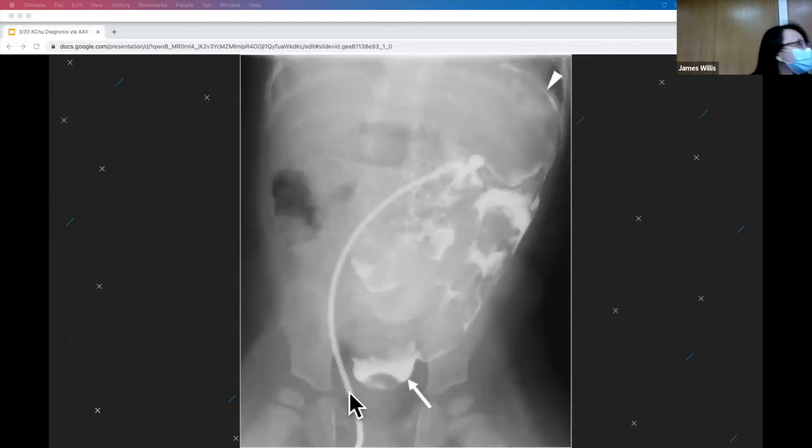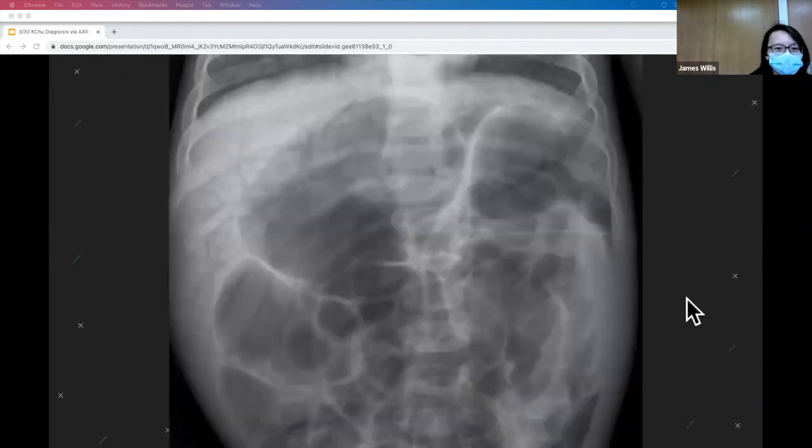All right, Sam. Yeah, it's contrast. Where does it come from? Well, it's not going up the rectum. So there's contrast extravasation from a G tube here. If you had to do contrast up, which you usually don't, you should see a contrast line up from the bottom end. But here the contrast is coming through the G tube and it's extravasating. This is extravasation of contrast from a G tube. Okay.